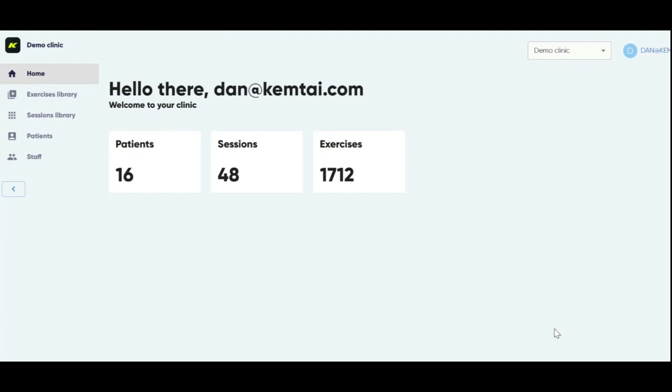Today we will do a walkthrough of the Kemtai Care Clinician Dashboard. So first of all, after you sign up, you will be taken to this screen. This is the demo clinic we have at Kemtai. You will notice a few things here.